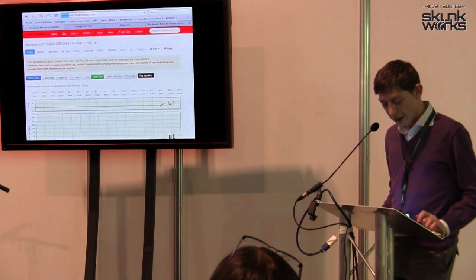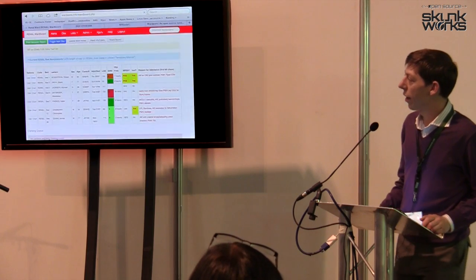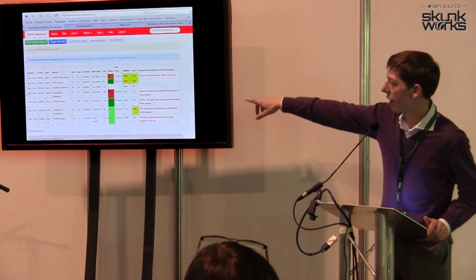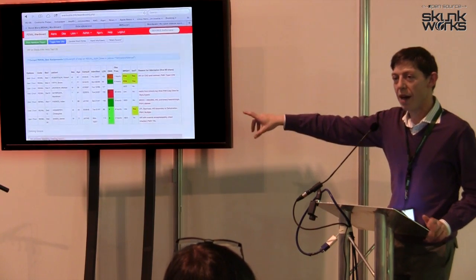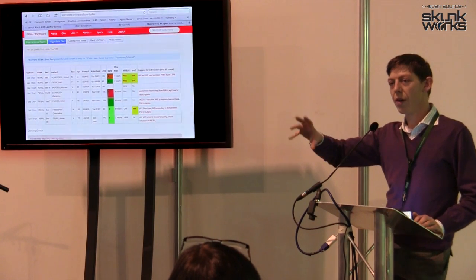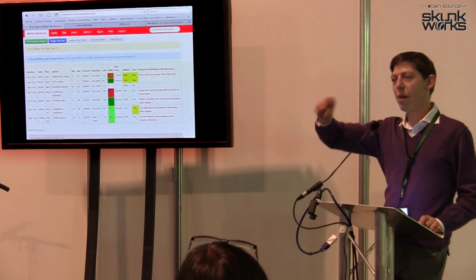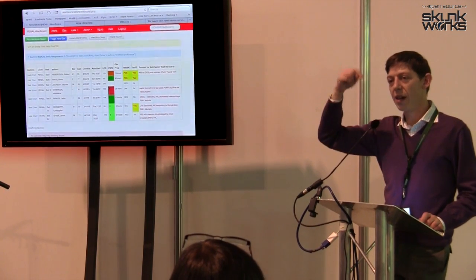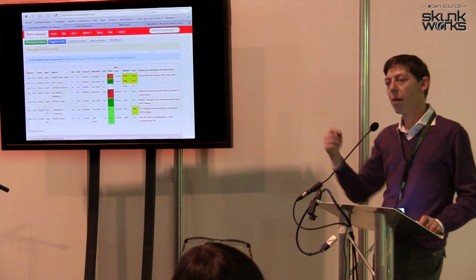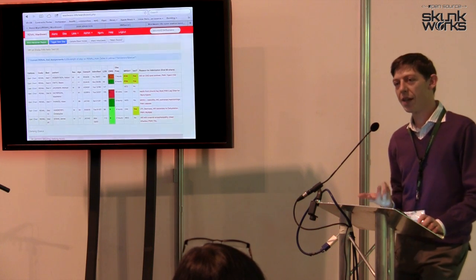So for hospital outreach people, can we get a whole hospital at once view? Yes, we can. Here we have a single ward view, and you can see all the patients and the EWS. What we've been working with at Luton in their operations room, they have a whole trust view sorted by early warning score. So the sickest patients are at the top of the list, and you can have a sort of real-time audit that people are doing their 30-minute observations, or are doing what they're supposed to be doing.